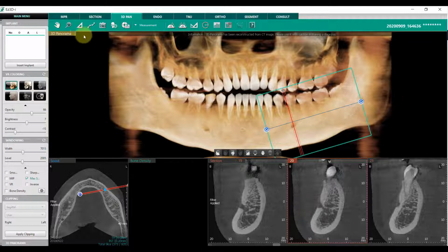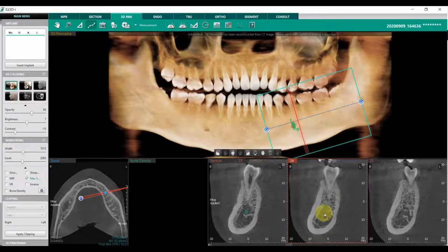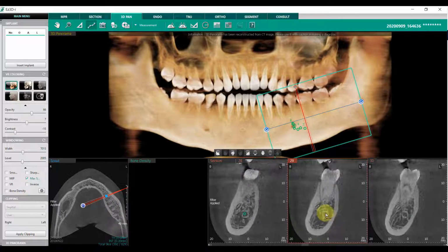So I am going to click on the nerve tracing icon here, draw canal, and I'm going to simply do a series of left clicks. I'm going to start a little bit outside here as I go into my exit area. Then, to navigate, I'm just going to scroll back, click, scroll back a few times, click, and keep continuing that process.